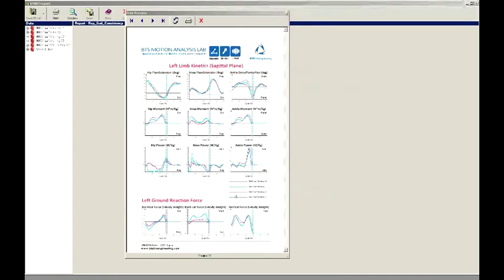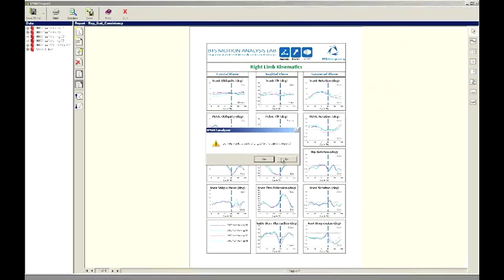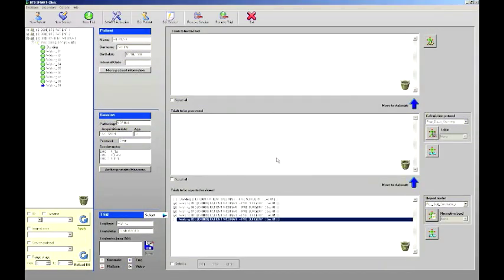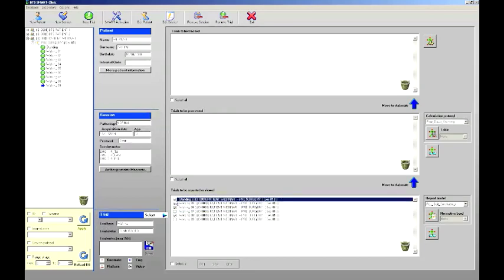After identifying the trials that are not good, close this report without saving. And in the panel, let's disable the trials that you want to discard. In our case, the walking number 7. Now, reload the standing trial and all the good trials, selecting the report model rep-gait. You have also to add the normative band according to the age of the patient. Click on the button to open the final clinical report.